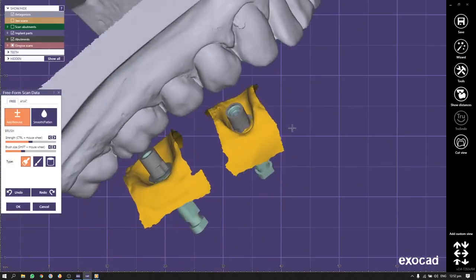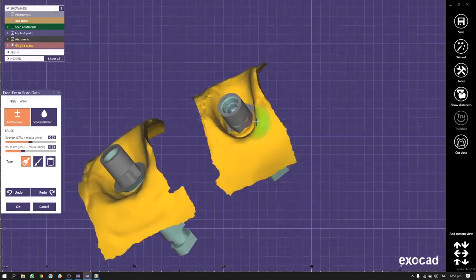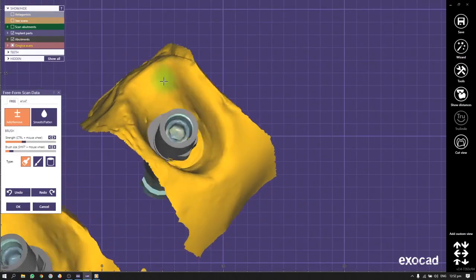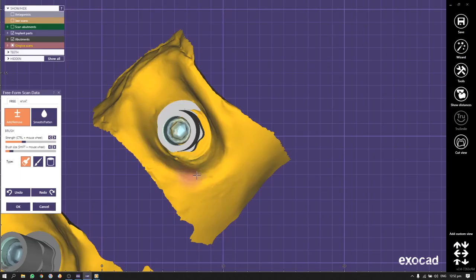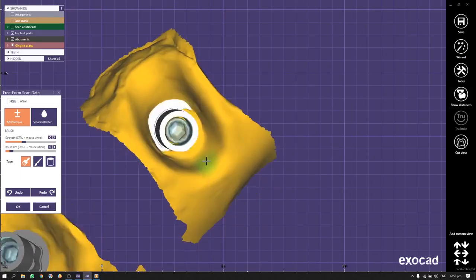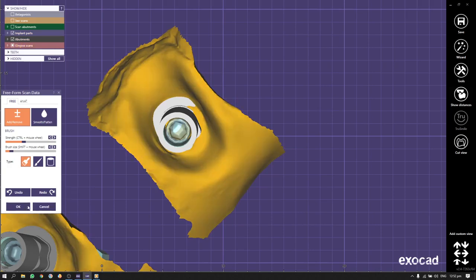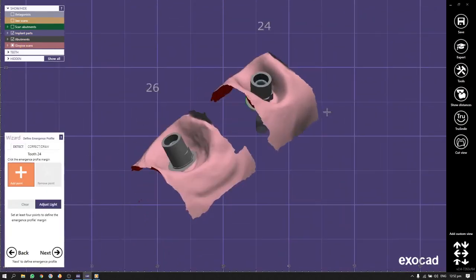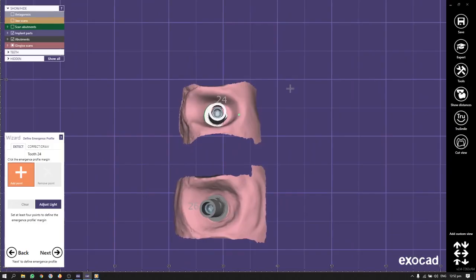Right now, I can create any form I need with the help of the Ctrl Shift or Shift. And we press OK. I like it. I'll go to the wizard mode again, and we keep on working here.